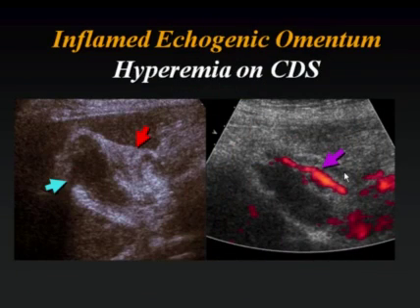Now, the inflamed echogenic fat that's around the gallbladder in the pericholecystic space is inflamed fat from the omentum. Remember, the omentum is the policeman of the abdomen. Its job is to wall off perforations and abscesses. And what we're seeing in this case is actually omental flow. This is not in the wall of the gallbladder. This is hyperemia within the omentum.